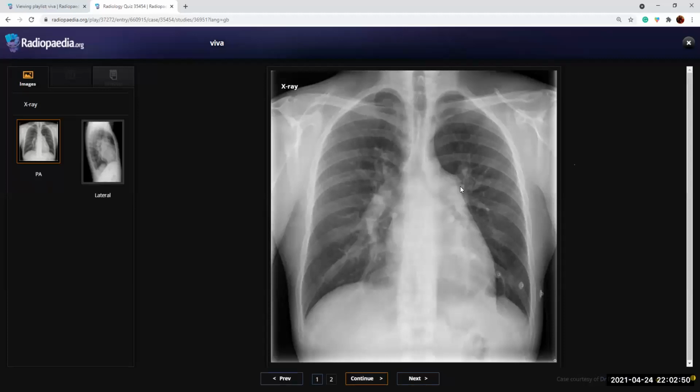Okay. This was a case of ASD actually. That's the commonest cause, ASD, atrial septal defect. In a young patient, we have to keep that in mind. PH features are classical features: bulging of the pulmonary conus and hilar prominence, vascular plethora is there. So this is the commonest cause in this young patient.